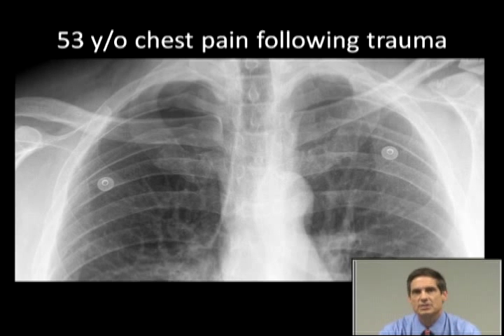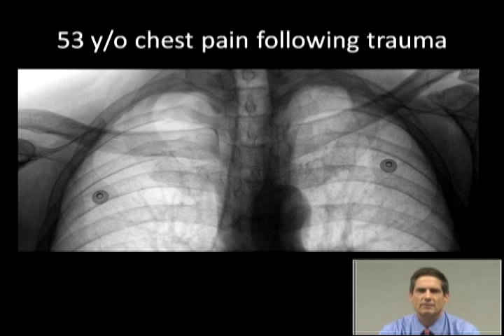If you blow up the chest x-ray, you can appreciate that in the right lung apex, on our left, the lung markings do not go all the way out to the lung periphery. On the left, they do. And this arrow emphasizes that fact. Here we are with an inverted image. Sometimes it's a little easier to appreciate that the lung markings don't go all the way out with an inverted image. And again, an arrow delineates the area of the lung with the decreased lung markings.